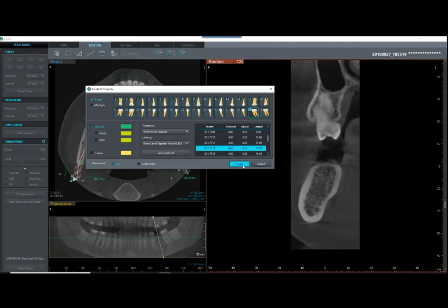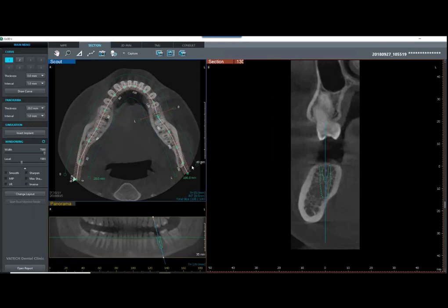So I'm going to click on insert. And it would place our implant there. And then we can position from there. Paul, thank you for taking us through that exercise. We went through our insert implant, changed our angle down here, platform at the green line, and now we have our implant placed. I can rotate, and I can grab my implant bodily and move that around if I need to.